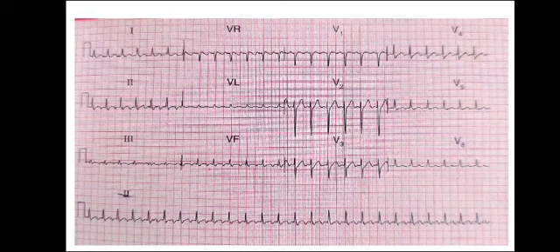Now, in this last ECG, first of all, the rhythm. If you concentrate, you will see that here is a P wave, but here another P wave is just mixing with the T wave. You can see a very broad T wave over here and a P wave over here. So basically these are two P waves preceding QRS complexes. So the rhythm is atrial flutter. You can find it very well in the lead 2 as well.